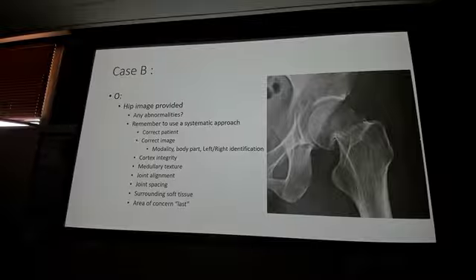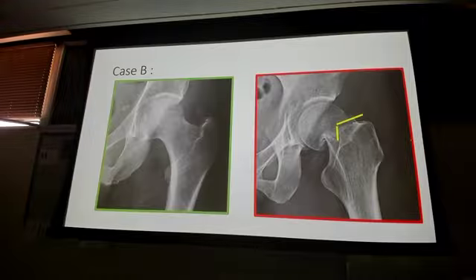A little bit less time on this one, just because it's an exact picture we've seen before in the slides. So there's our abnormal. There's my abnormal with positive yellow line sign.